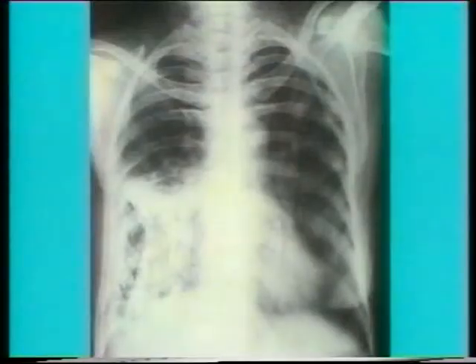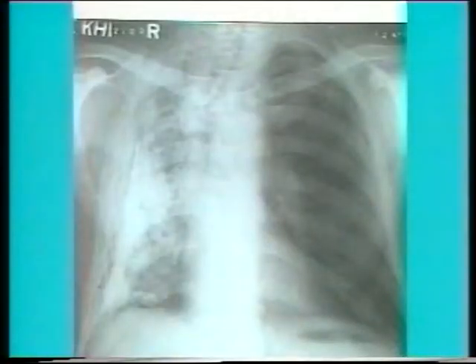This is another typical pleural calcification. It is a very dense and irregular sheet-like opacity with no fixed distribution pattern. Note the sheet-like opacity denser than the ribs with no fixed pattern. This is another X-ray of pleural calcification with dense irregular sheet-like opacity. Note in the close-up view its density, pattern and the typical appearance.